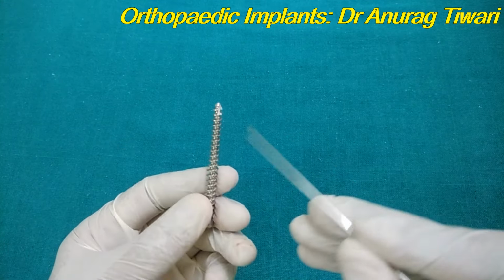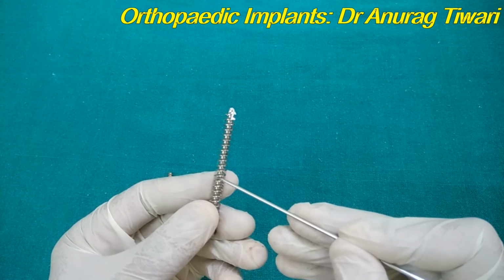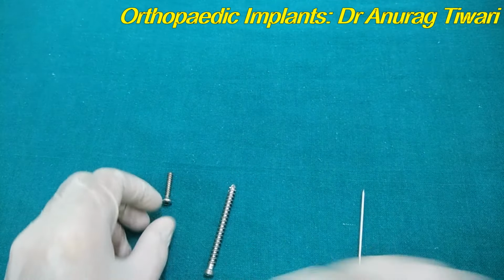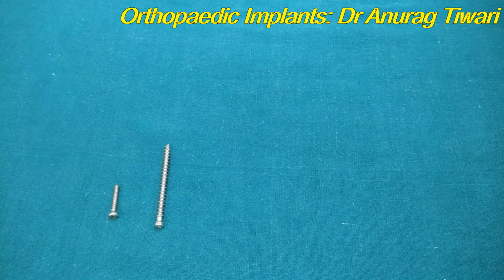If you see the cancellous screw, the depth is more in order to accommodate more and more cancellous bone, to have an increased purchase of the screw, and the pitch of the screw is also more. The pitch is the distance between the two threads. So one is the cortical and the cancellous. This we have covered, that is how to differentiate between the cortical screw and the cancellous screw.